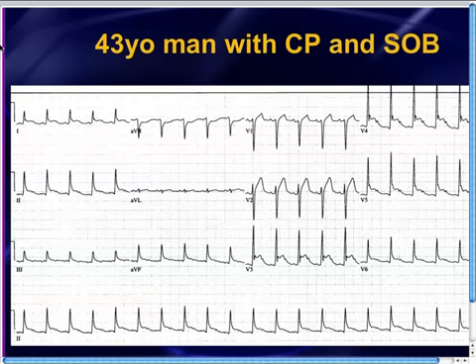If you look at the rhythm down there in lead 2 at the bottom rhythm strip, what you might be noticing is that there are these little extra blips, and we established last week that blips is the technical term for these little extra beats that you see in here. And in fact, in multiple other leads, take a look at lead V3. You've got those blips in there as well, and up in lead 4 and in lead 5.